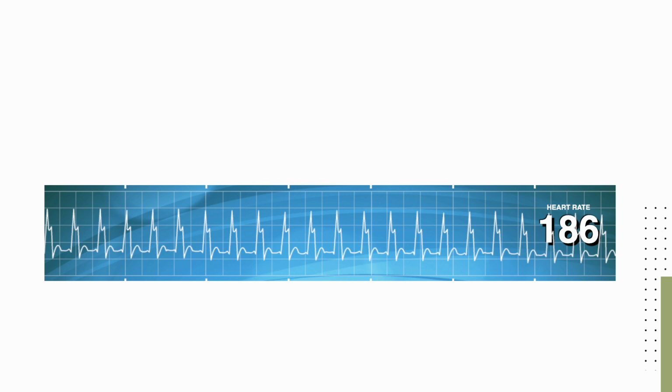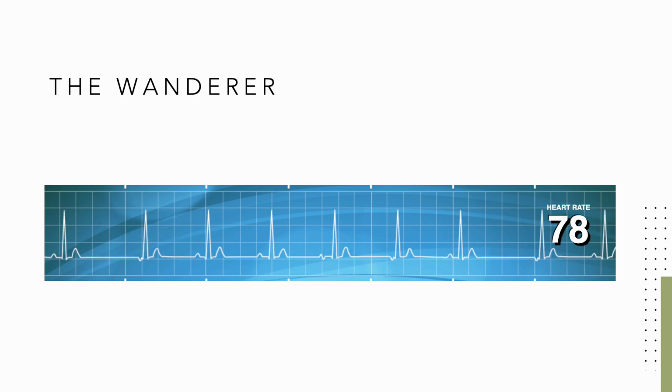This final junctional rhythm is very fast and it's very similar to SVT. However, if you look closely, buried within the QRS complex is an inverted P wave towards the top. You can also see the presence of a T wave. If you still have P's and T's that are separate, you do not have SVT. This is a junctional tachycardia. This rhythm is a result of even further enhanced automaticity, like from sympathetic nervous activation.